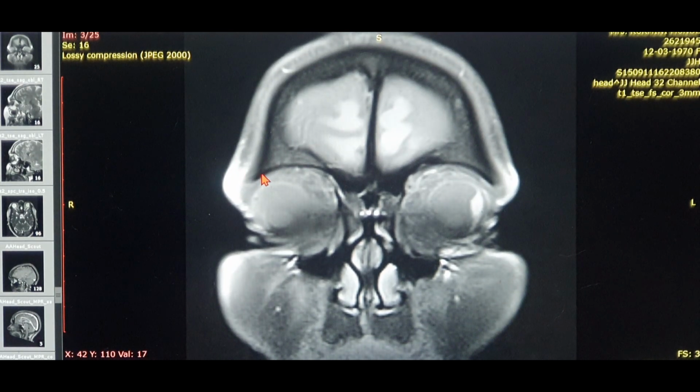Now this is the thick, bony, pitch dark shadow over here. That suggests it's the skull base. That's the bone over there. Whatever black you see is going to be bone and air. If we correspond this very same image to a CT scan, we're going to see a thin to thick plate of skull base bone over here, which separates the orbit and the frontal lobe. You can see the frontal sinus in this case.